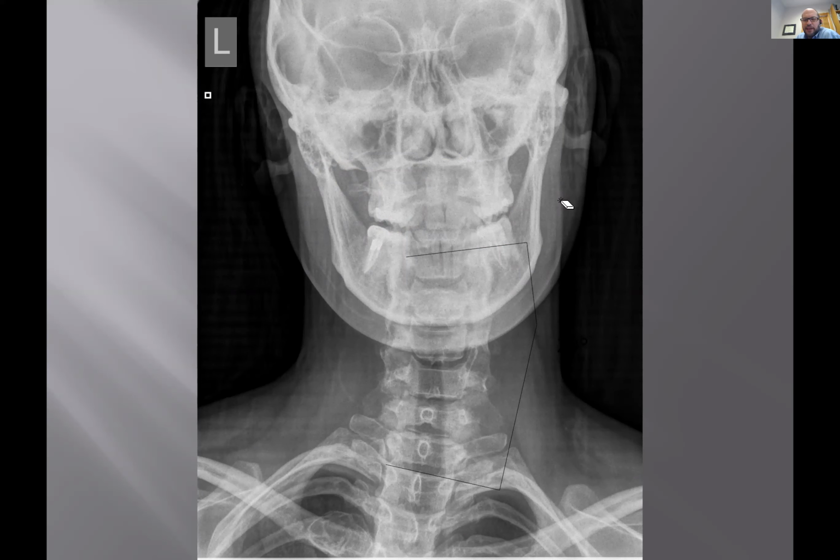Where's the abnormality? Look at all 4 corners of the film. Look at the edge of the film. Hurts in the upper back. Where's the abnormality? Soft tissue trap. I think the soft tissue has some digital film artifact. They're okay. That's a fake out there. Okay, keep looking. Thanks for guessing. No penalty for guessing around here.